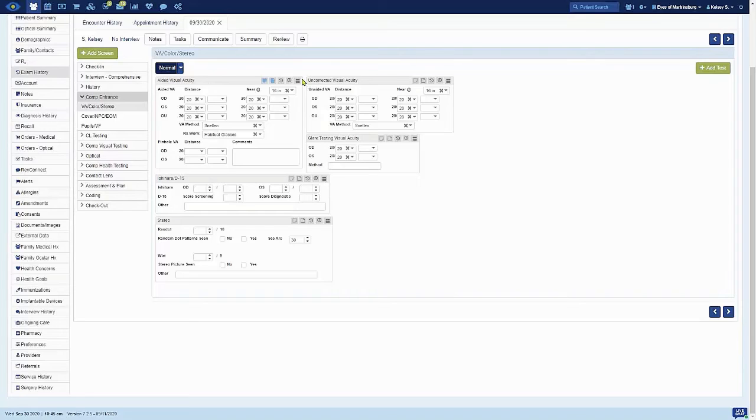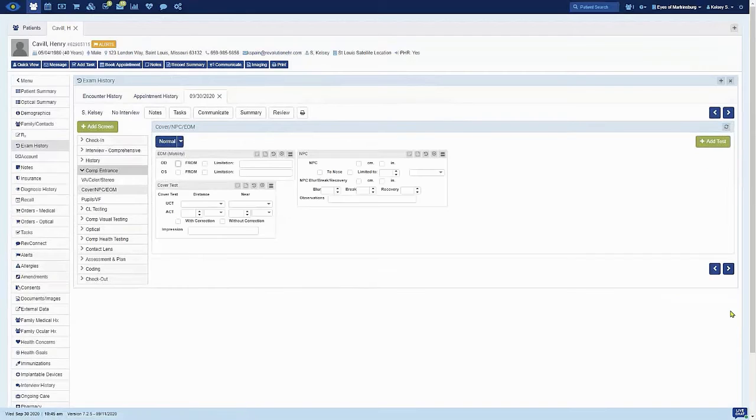So you're basically going to have a button where if you enter in your left eye information, you can use this button to enter in the right eye information. It'll just copy it straight over and you won't have to enter it. Now, once you are satisfied with your data entry, make sure to click your next button. This is the only way to truly save information.